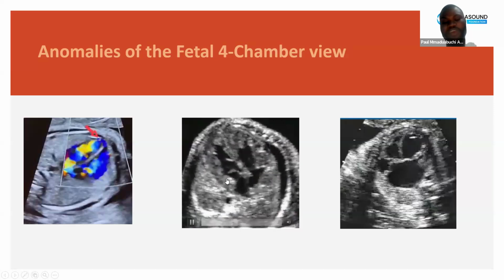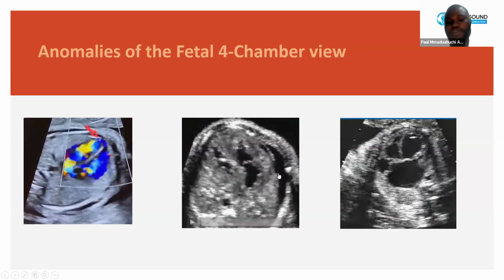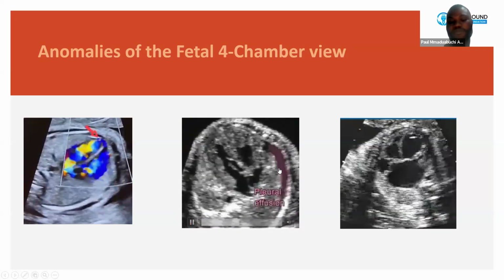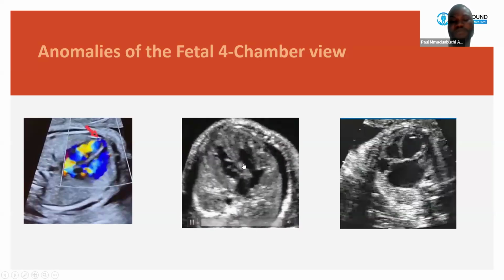And when Lashell was talking about the arrhythmias, the contractility of the heart is very slow, and you could see more collection of fluid, pleural and pericardial fluids, being collected more than the normal that was shown previously in the normal heart that I mentioned. So this is much pleural effusion, collected pericardial fluid collection leading to the diagnosis of pleural effusion. And this is the poor contractility of the ventricles and the atrium.